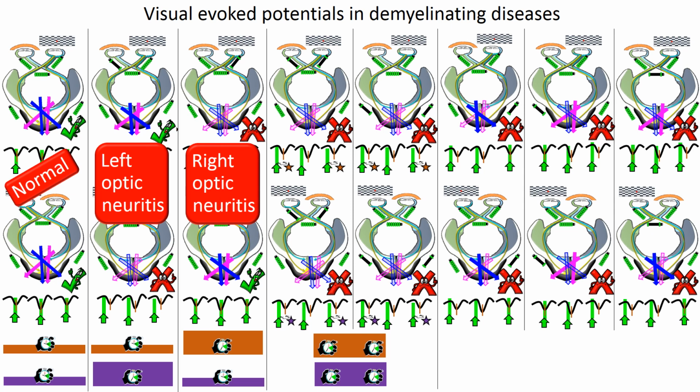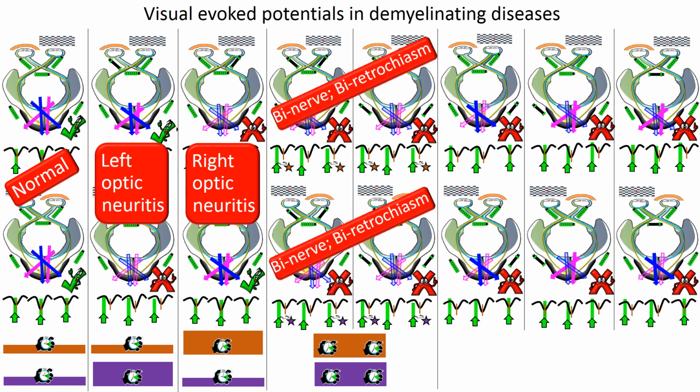indicate a certain pathology. These findings that I have now represented in the lower part of the frame under the fourth and the fifth columns by rectangles with little clocks at the borders with their handles past the green area indicate bilateral delayed parasagittal P100 latencies. The only conclusion we can draw in the presence of such findings is that the study is consistent with bilateral optic nerve or bilateral retrochiasmatic disease.